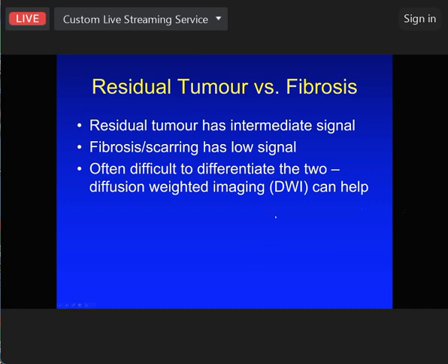Anyway, we can show with great accuracy how water molecules are moving amongst the tissues, both extracellular and intracellular, by using diffusion-weighted imaging on MR. And the basic concept is that if you've got restricted diffusion, the image of that area will be white, and if you've got free diffusion, it will be dark.